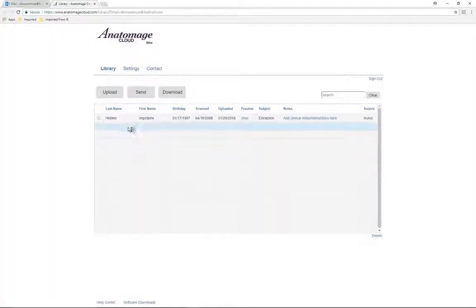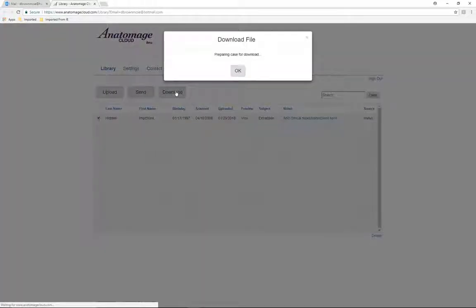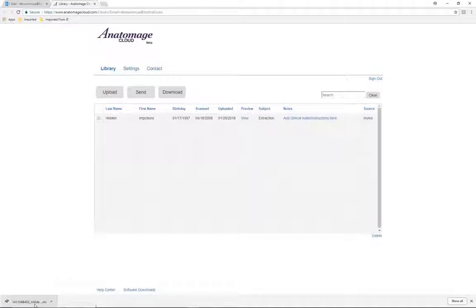The recipient of the email can then download the file and view it on their full version of TxSTUDIO, or preview the case through the browser viewer, or download the viewer and scan for further use.